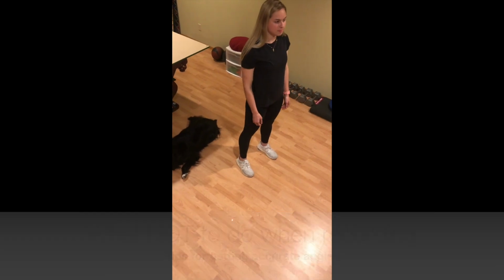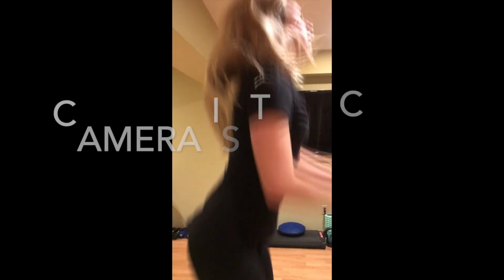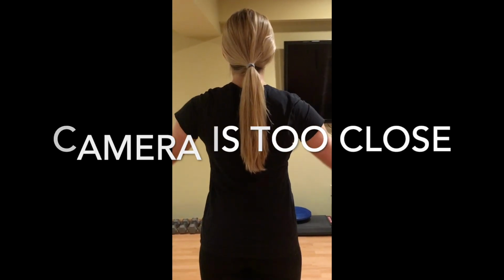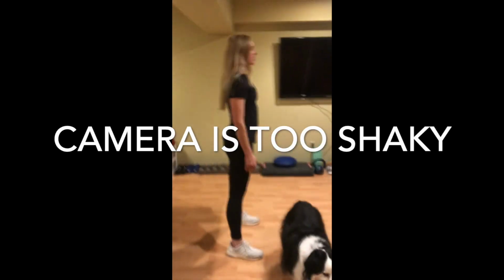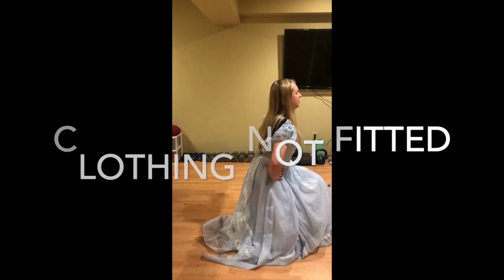It's important to position the camera directly to the side of the subject at a 90-degree angle reference. Make sure the camera is close enough to see the subject through the full range of motion, but not too far away. Keep the camera still. It's best if it's stabilized on a tripod or surface. Ensure the subject has on fitted clothing so you can see the body shape through the motion.